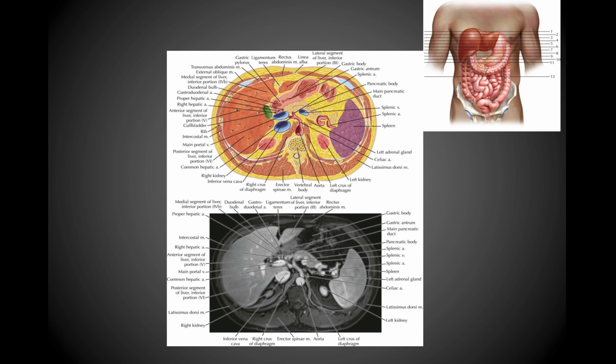Next image, now you can see just a small part of the gallbladder. So again, you can see that shown here in green. So that's a notable new feature in this section. You can of course see part of the stomach, and then moving down towards the pyloric sphincter as well. And so again, that's what we're seeing right through here. As you can see, part of the stomach, and then moving in towards the pyloric sphincter and the duodenum.